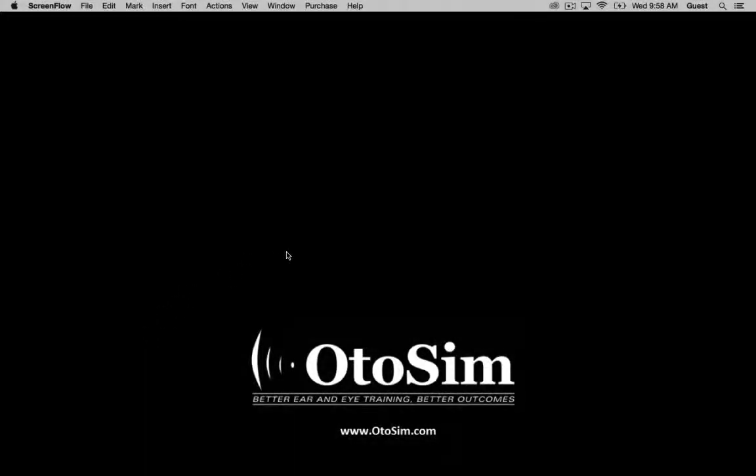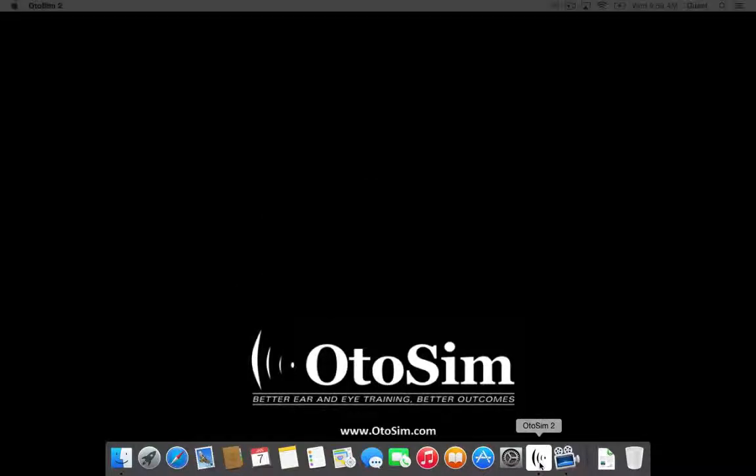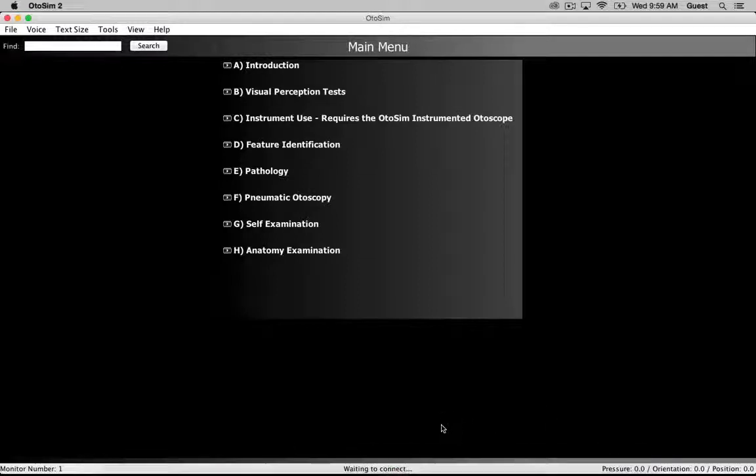So right now on the screen, you will see our logo, and I'm going to open up the Otosim 2 software, which is in your applications folder at the bottom. Otosim 2, click, and this is our splash screen. And we'll go over this program in fairly good detail to show you some of the features that are different from our previous version, and also explain some of the importance of our newest additions.